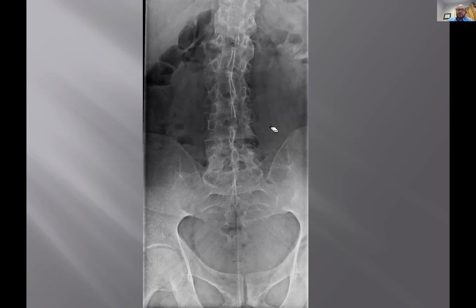Don't get search satisfaction. For this case, ankylosing spondylitis fuses the sacroiliac joints. That's an easy question. It's an easy question if you're a multiple choice radiologist. But if you're doing radiology, fused SI joints are tough to see because they're missing. Okay? Now, I'm going to do one more case. But I'm going to review the stuff you need to know for the quiz that you're going to take right away and go get your points. Am I right? So here it is.